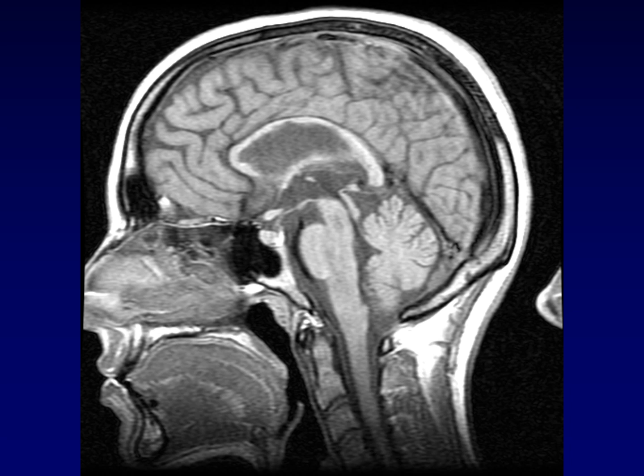Here's an MRI in the sagittal plane of a patient with a chronic disease. You notice anything about this that differentiates it from some of the other examples I've been showing? Well, one thing to notice is how thin the corpus callosum is. It's thin and it's ratty and irregular, much thinner than that nice normal one I pointed out in the first half of the lecture.